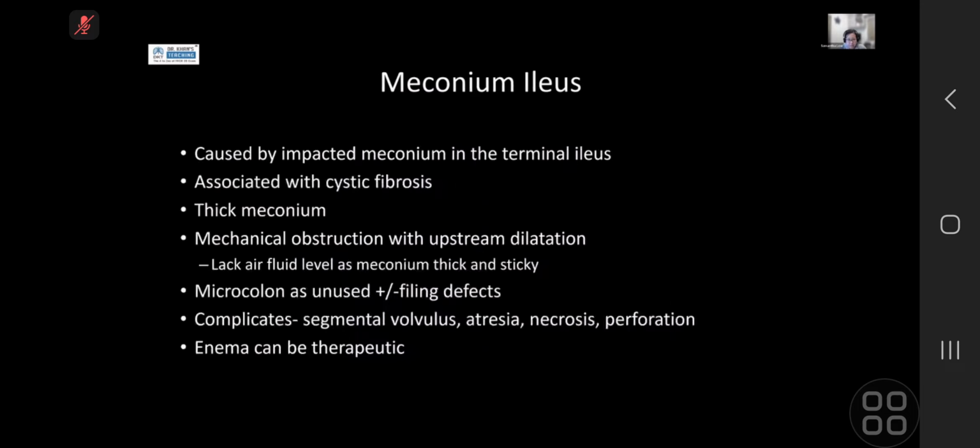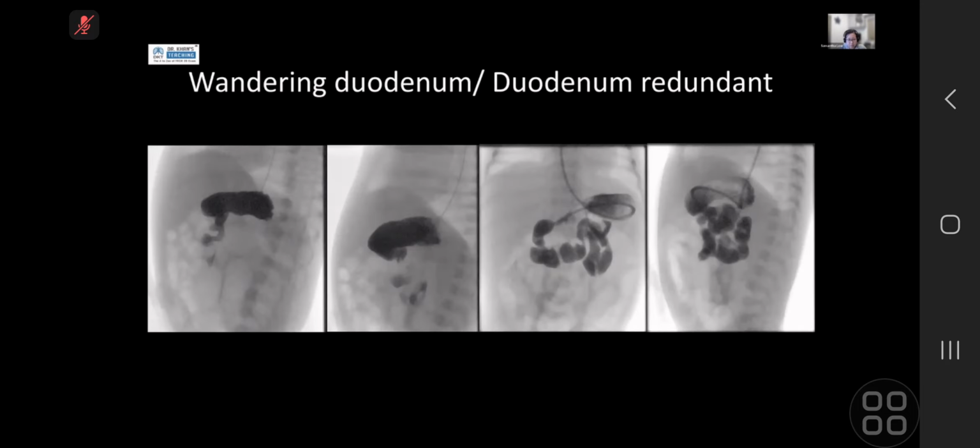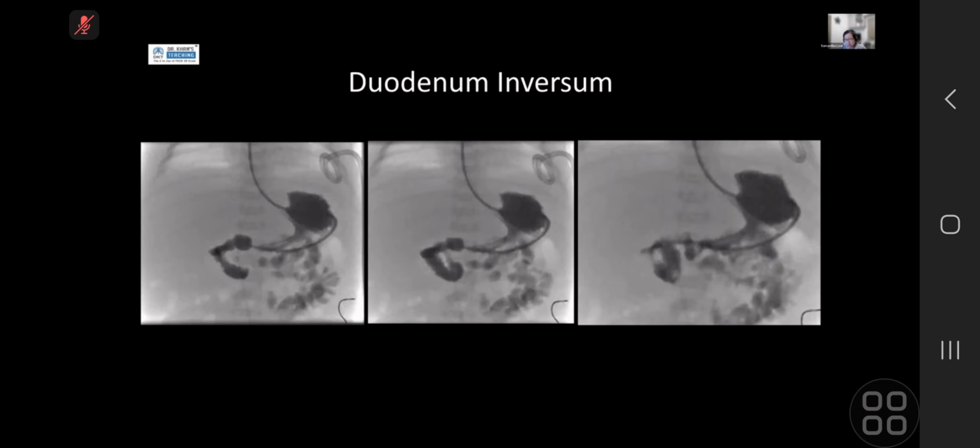What is duodenum inversum? As I said earlier, it's a duodenal variant. There is a very nice Radiographics paper, I can't remember who described it, probably from the 1930s or 1940s, which says that instead of the small bowel forming that routine nice C shape going past to the third part, the duodenum is slightly redundant, and it goes up, superiorly and towards the right, before going across the spine to the left side, to the DJ flexure. Okay, so that's duodenum inversum.